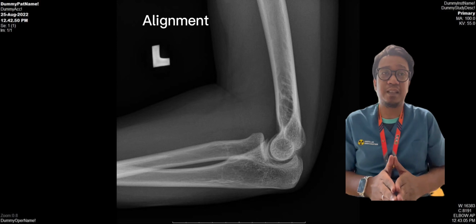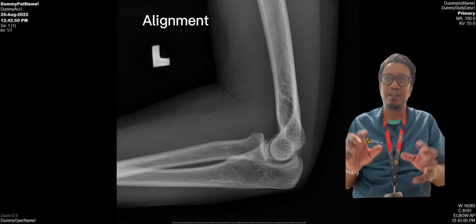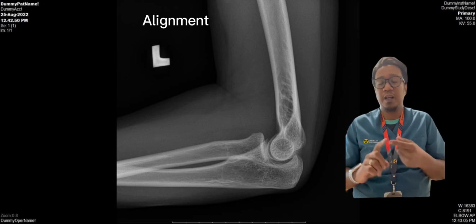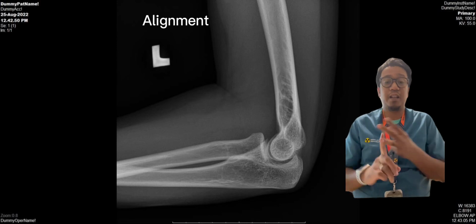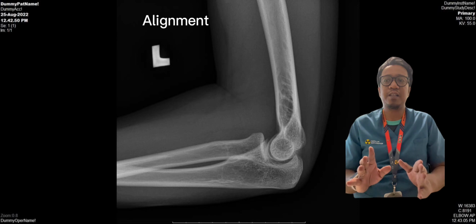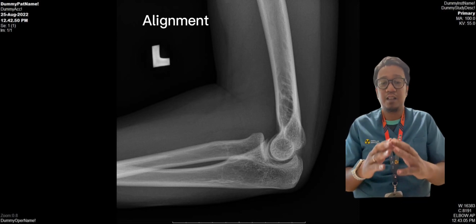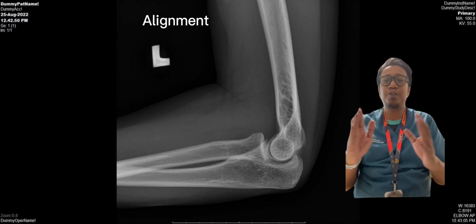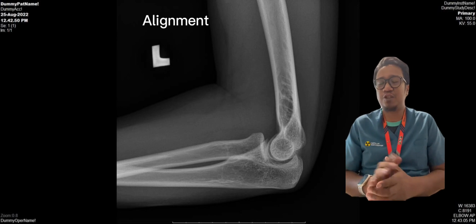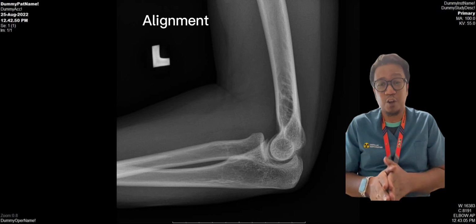So we continue with the A. A is for alignment. In this criteria, we have 3 alignments. The first is patient with beam, then beam with IR, and IR with patient. The alignment is demonstrated through the collimation. From this radiograph, the alignment between X-ray tube and cassette cannot be determined because there is no evidence of collimation.